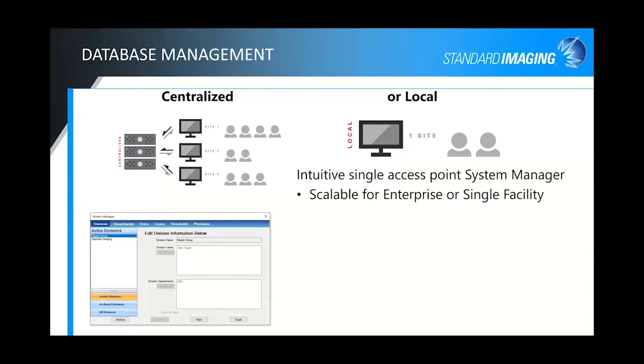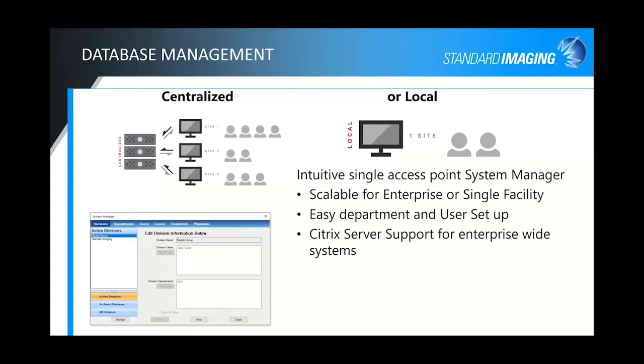and the database is centralized for those tests, and you can actually look and compare and see how tests at each facility are comparing to each other. Very easy department and user setup. You can see on the little screenshot in the lower corner, we're breaking it down into divisions, which is that overarching component, the departments, your individual facilities and clinics, users, LINACs, thresholds, and phantoms, and I'll touch on those as we move along. The departments being the actual facilities themselves.